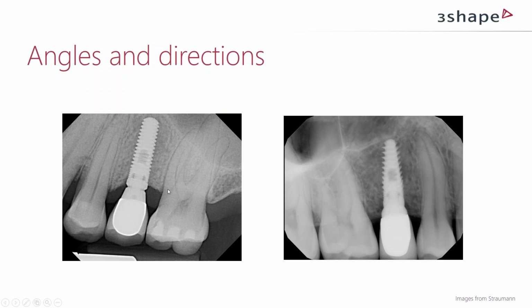Of course, if there is no bone, or if you need to place it in one position because it's too tight between the two teeth for the crown, then you have to do side steps and find another solution. But if there is room, always follow nature because it's done once, very good, and we can maybe do it once again as good.